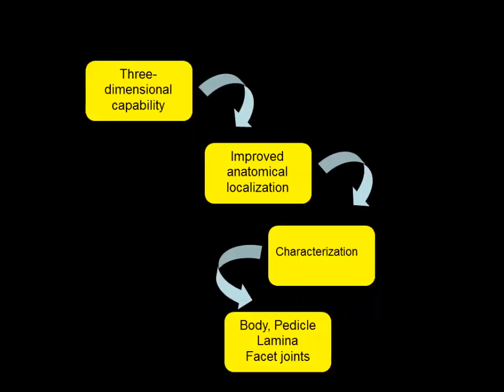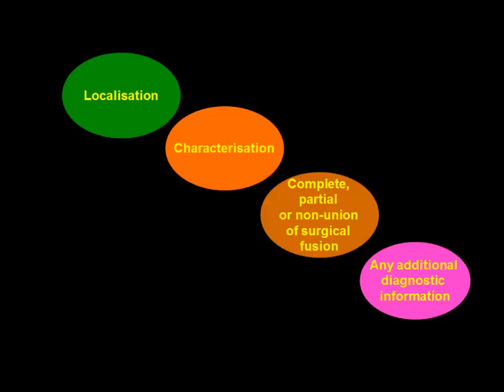It's three-dimensional imaging. It improves the localization of the pathology, defines the anatomy. It characterizes the lesion, whether it may be in the body, pedicle, lamina, or facet. Again, the same point: localization, characterization.